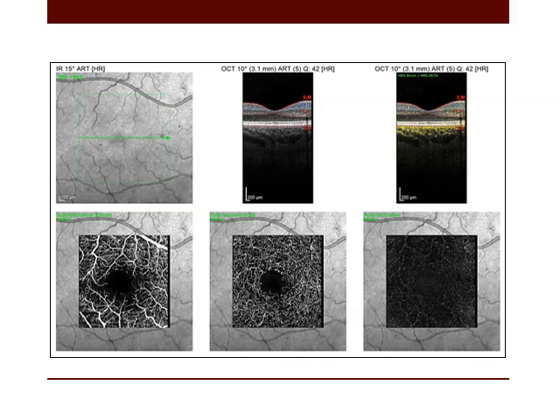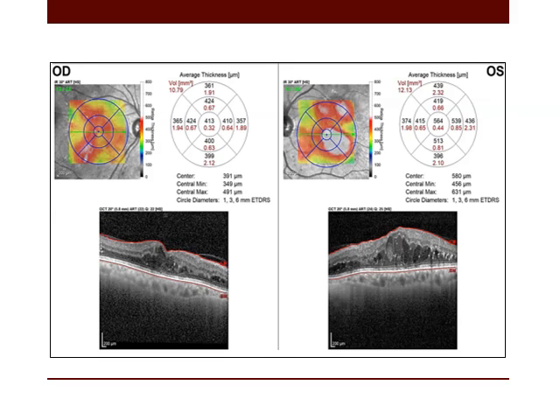So let's see about this patient. This is a patient with diabetic retinopathy, no thickening in the macula, everything is okay. But if you see OCT angio, you will detect fine ischemic changes in the superficial plexus and very evident ischemic changes in the deep vascular plexus. What about patients with more advanced diabetic state?